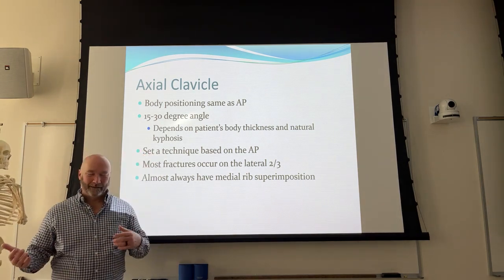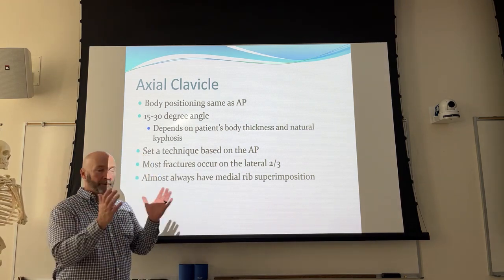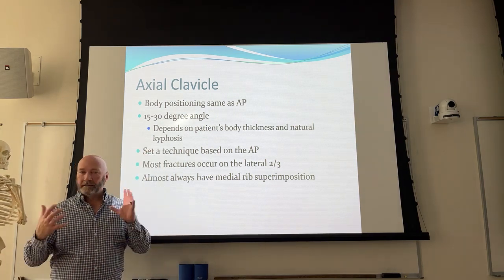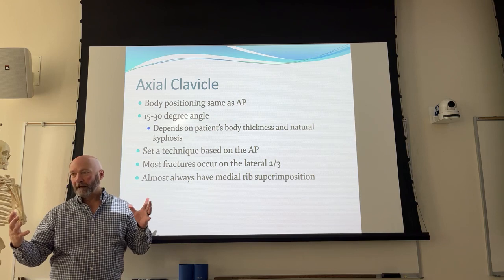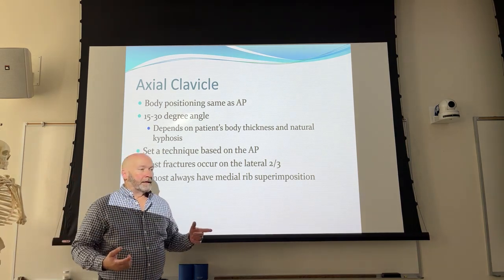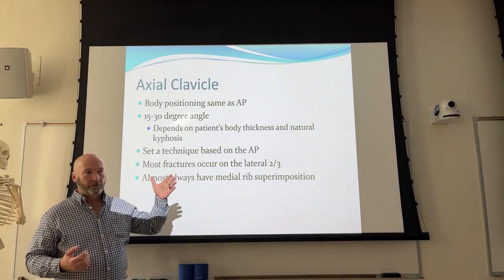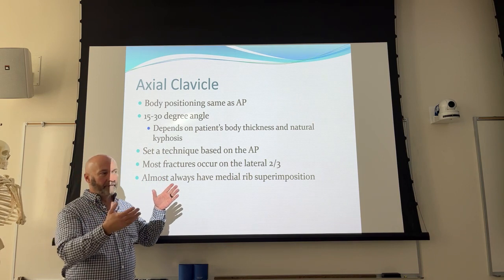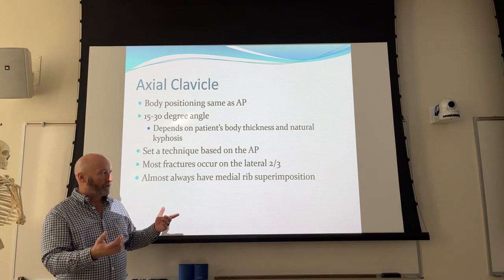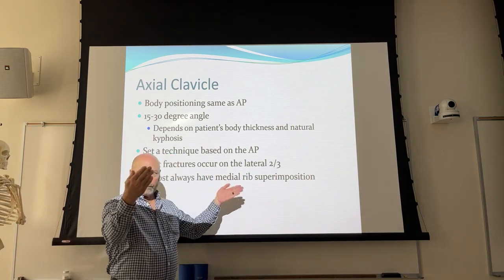And let me reword that. People with barrel chests versus people with very narrow chests, because those are totally different things. You know, I've known people who had these big, thick chests and they never were fat, right? I mean, just big, thick chests. So what we're trying to do is get the clavicle above the ribs on the lateral portion, lateral 2/3, 3/4 of the clavicle, right? So if you've got a patient, let's say our clavicles are this big.